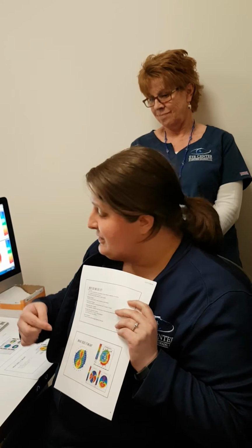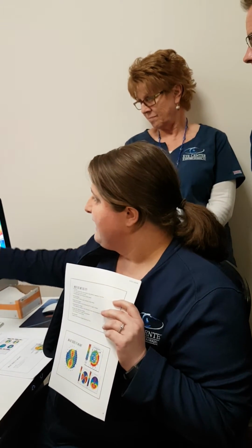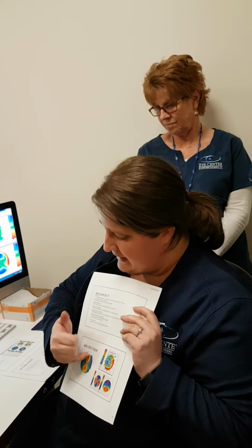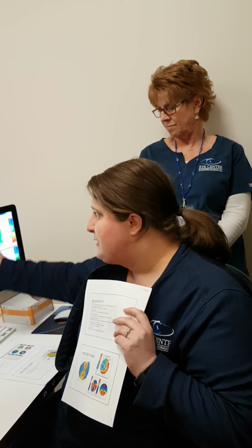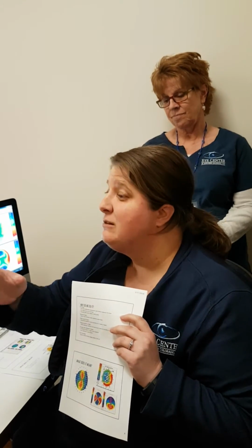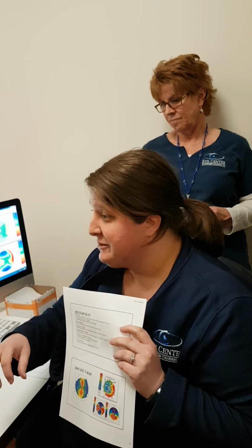The doctor uses the simulated Ks where it says the axis is, and kind of looks at the map to say, okay, they're mostly lined up in this direction with regard to that red line, giving you the steepest axis. It's mostly lined up here. He also takes into account where the axis is on the refraction. So super important that you at least attempt a refraction.